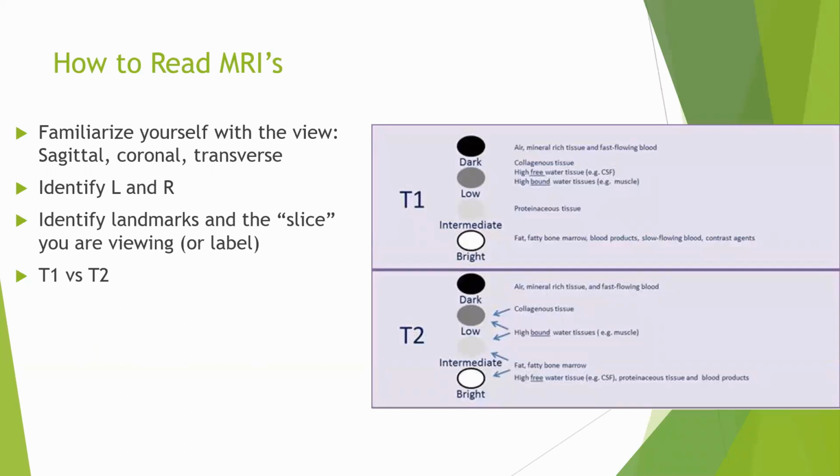And what you are trying to find, if it's there, like a disc bulge or hernia, or a hamstring tear, or a quadriceps sprain, or patellar tendinitis, is easy to find because there will be inflammation, right? And then certainly you will know if it's a T1 or a T2 weighted image. And this is what T1 and T2 will be, as I have told you. T2, water, white; T1, fat, white. As an orthopedic or musculoskeletal practitioner, you will look at the T2 weighted first. That's it.